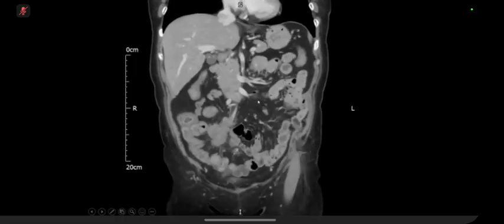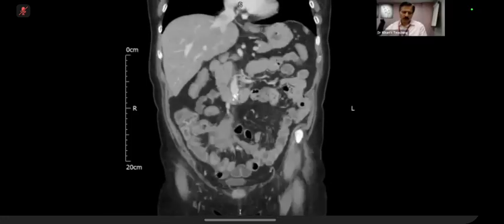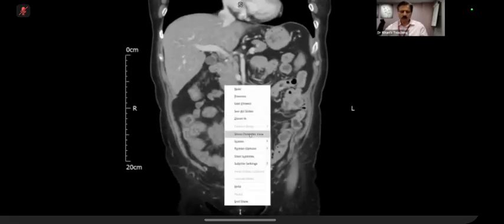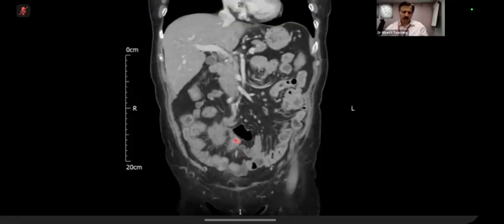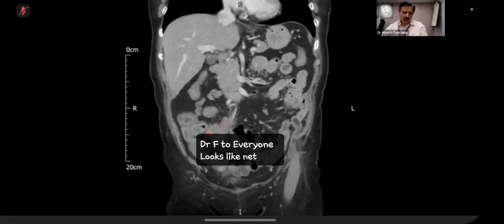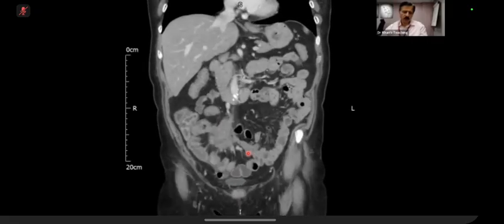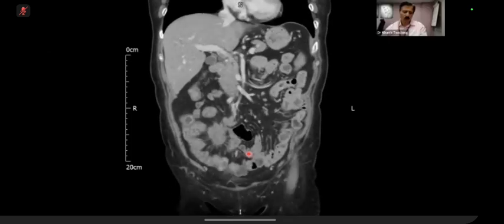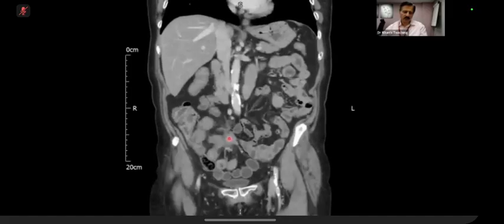If you concentrate on this case, and this is a very important concept which you have to remember, this also is a case of lymphoma. Here, what is happening is, it will tell you that this soft tissue is a lymphoma. You did well in your case where you were trying to rule out a carcinoid. And carcinoid classically will also cause desmoplastic reaction. There might be calcification. But what happens?